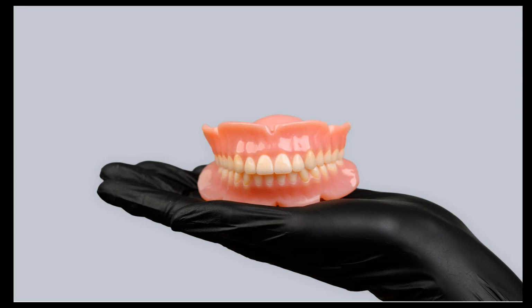After that, the first step would be running an analysis and repair on any issues we find with the mesh. So we fix it, and then the next step would be assigning base shades. We need to identify by that. This is the first thing that helps us understand which model is the base or the gingiva and which models are the teeth.